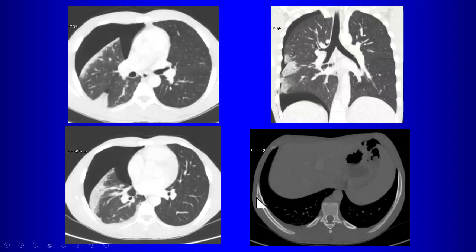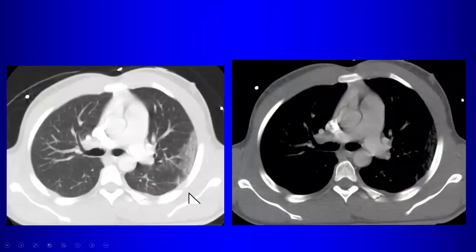That's contusion. Notice that there are rib fractures. So what happens when the lung mashes up against the chest wall, you get these contusions in the periphery of the lung. So these peripheral consolidations, peripheral areas of ground glass opacity, especially in patients with rib fractures, these represent pulmonary contusions. Okay? Another example, you have this ground glass opacity in the periphery, rib fracture, that's going to be a pulmonary contusion.